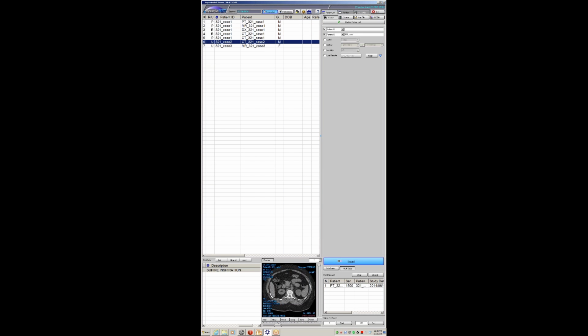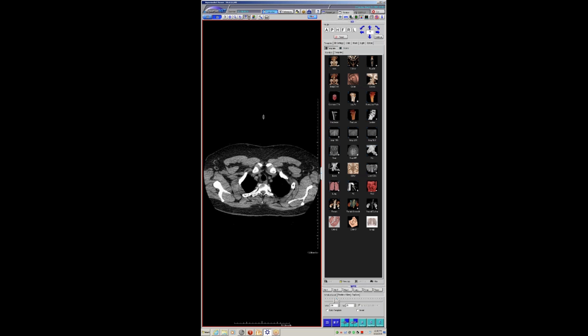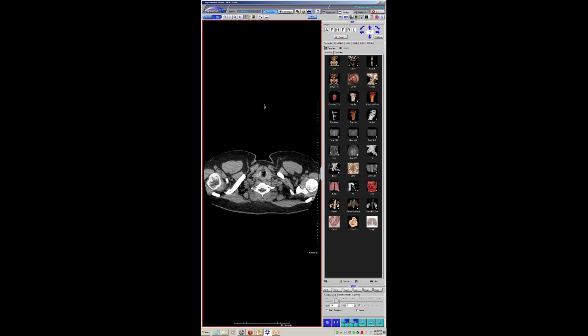The relation with asbestos exposure is questionable. The biggest paper, which isn't that big, said 33% have asbestos exposure, but a lot of cases I've seen were in younger patients, and he died a few months after this study, unfortunately. But a nice case of primary pericardial mesothelioma. And I showed a case a few months ago about a primary pericardial angiosarcoma, which looks exactly the same. I assumed it was going to be another meso case, but that was actually a primary pericardial angiosarcoma. This case is interesting.